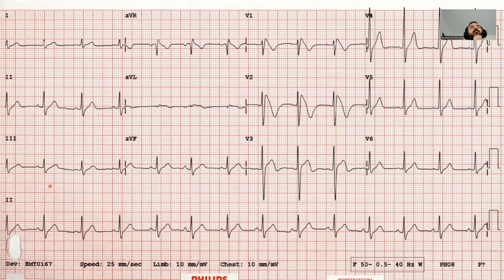Now, down here at the bottom, you'll notice this one doesn't have these little marks to help us tell where one ends or begins. That's because this is all just one lead, and you'll notice it's lead 2. Typically, we get the 2 lead down here nice and big for us, and that's because the second lead is usually the one that we're interpreting, right?